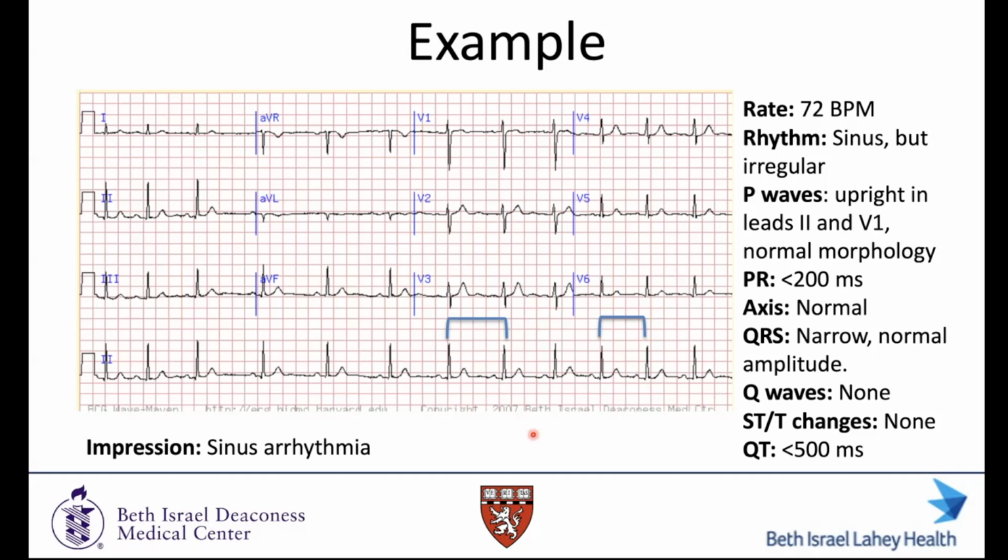No, I think it's absolutely right, but you'll see a lot of ECGs that look like this. And not that it makes a massive clinical difference, but sometimes this will be read as sinus rhythm with premature atrial contractions. The reason that's probably not the case here is that the P wave morphology looks very similar, and you'll see sinus arrhythmia often in younger patients with more heightened vagal tone. But otherwise, yeah, I agree, spot on.